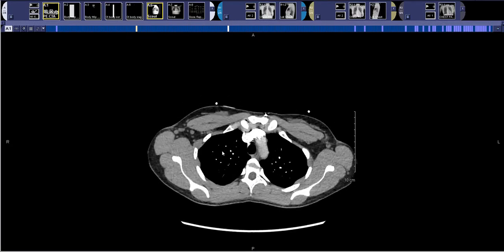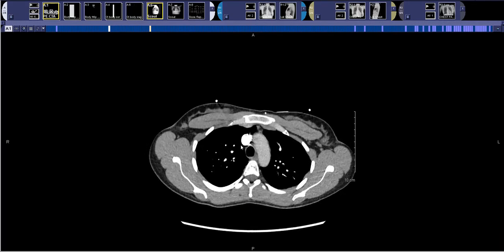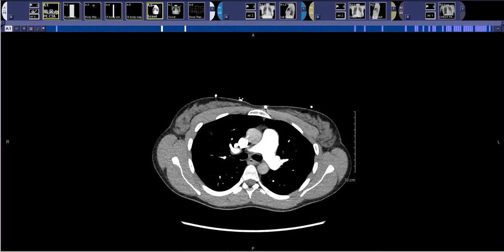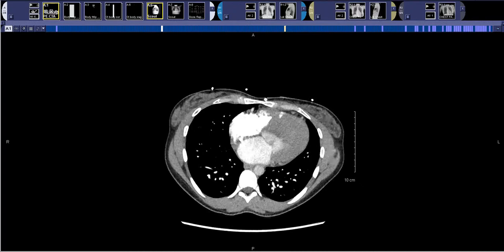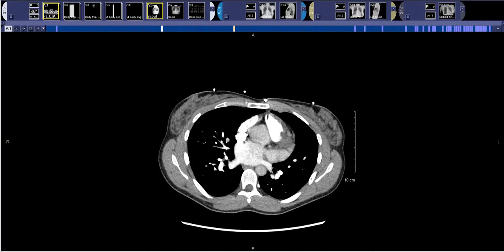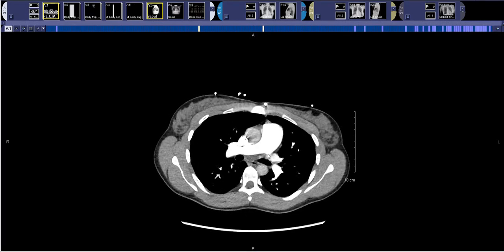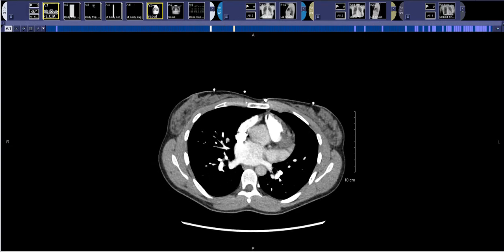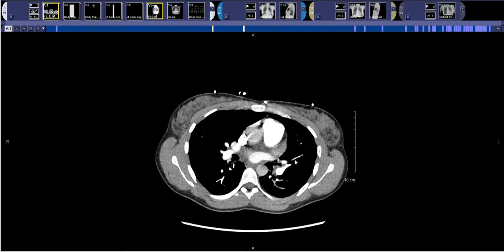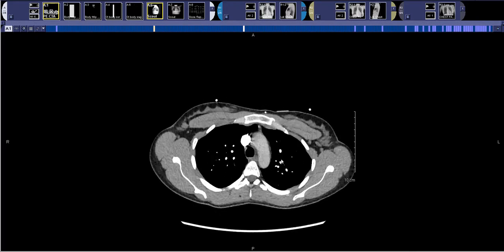Most of the large vessels are going to be in this area, and so part of it is like looking for nodules, where you're just scanning the larger area for abnormalities. When you're in the larger vessels, you're just looking at that one vessel or the couple vessels that are in an area for anything big. After I've done the right side, then I do the left side. I do the left lower lobe first, and then I do some of the lingular arteries here, and then I switch to the left upper lobe.